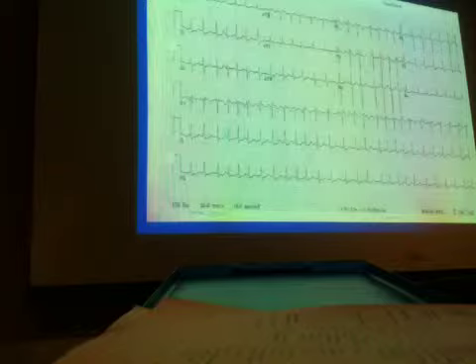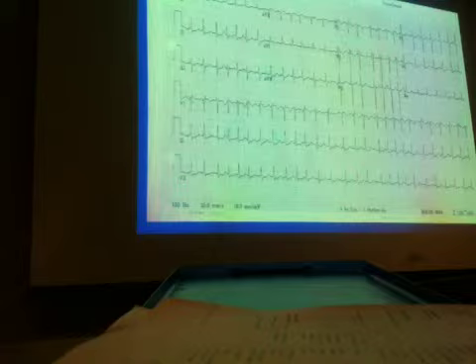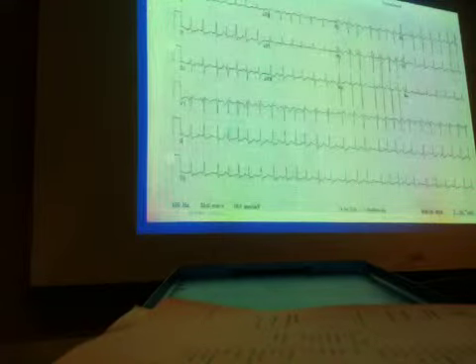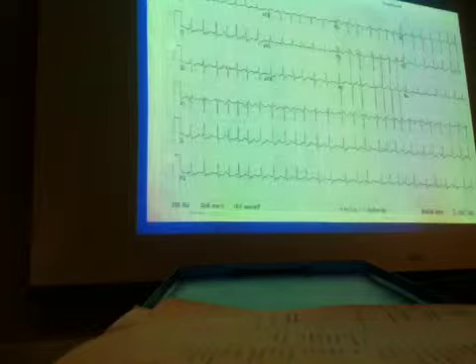So, remember what I said in the beginning, first impression? When you first glance at this, even you guys already know there's something not right with this, right? Looks very different than the normal nice one we had a few slides back. So, this is where we're going to start going down our roadmap. Okay, first impression, whoa, this looks a little weird.